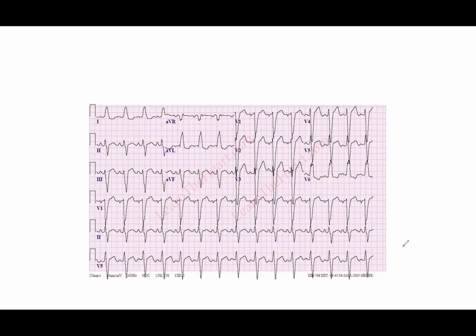All right, so it's looking a little sloppy, a little ugly, right? What's going on here? We've got these huge Qs going down into the lead below it. It's gross looking and makes it hard to see what's going on. But just like in traumatic injuries, you have what's called distracting injuries. Don't get distracted by the leads running into the lead below it. It just looks a little sloppy. We've got to look around that stuff, okay?